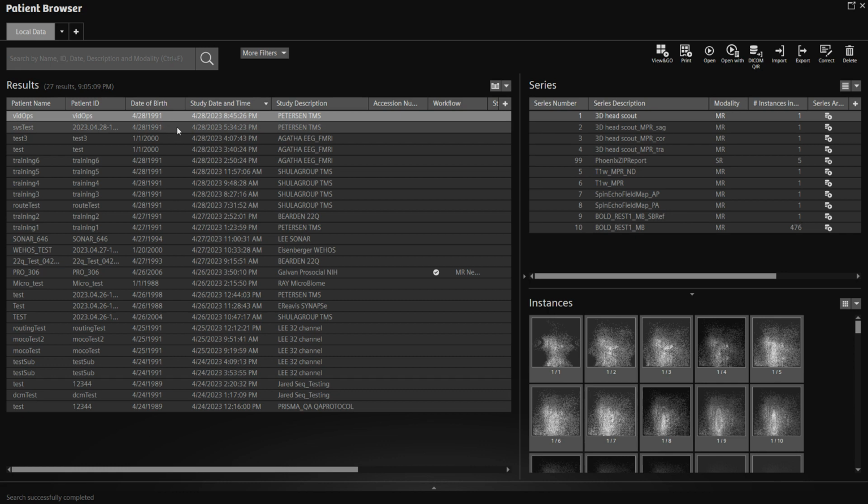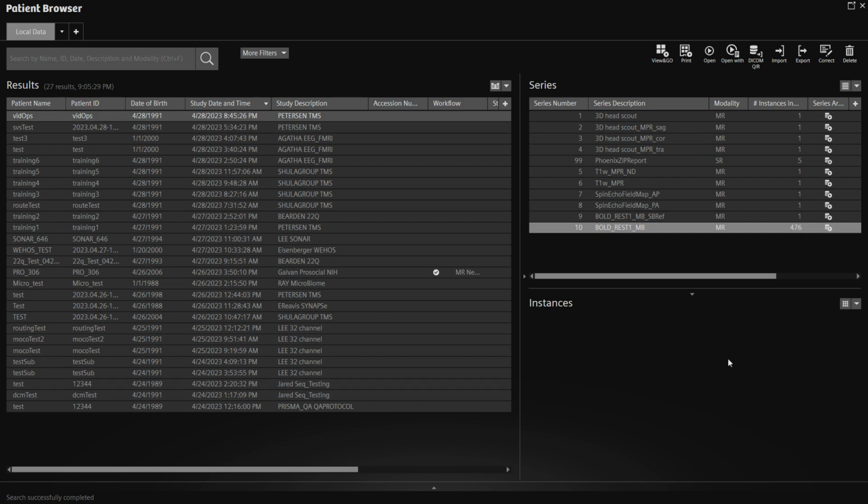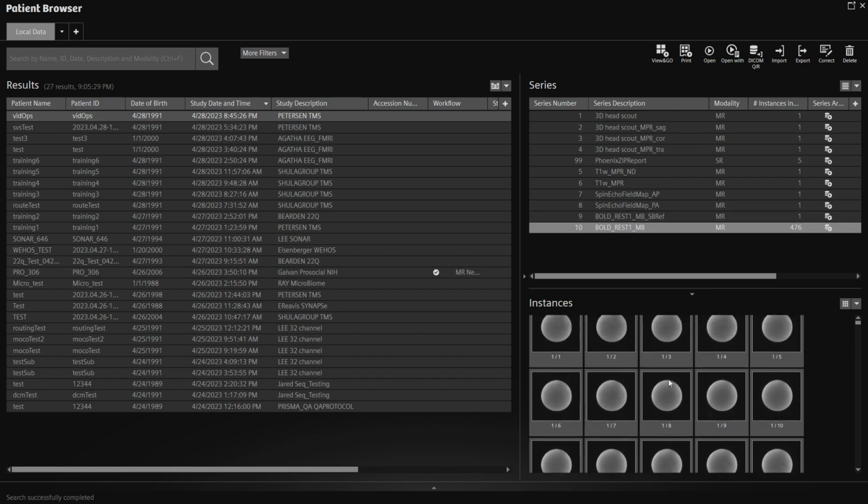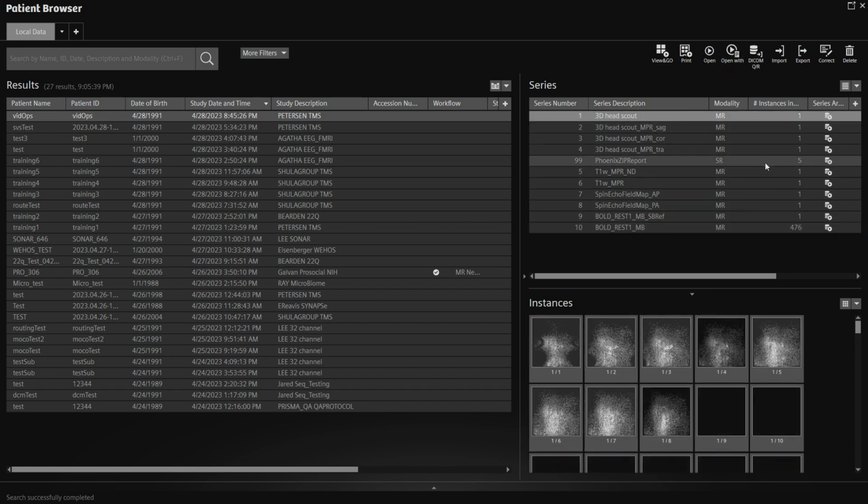description. When we click on a participant label, the series will appear based on the data that's in that participant folder. So here we have all of the images we've collected, and if we click on a specific image, it will load down here in the instance view. This is just a snapshot. You can see what the data looks like briefly. Now, one note about exporting data. We have the auto routing set up, so data will be sent to DICOM automatically.